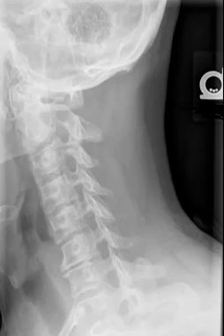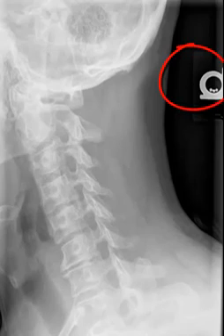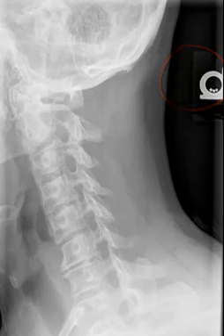When you're looking at cervical spine oblique projections and the clinician did not use a marker specifying whether it was an anterior oblique or a posterior oblique, we can simply deduce which side of the patient is which. If you pay close attention to our radiograph in the right-hand margin, your right-hand side, you'll notice that there's a left marker on the radiograph. This implies that this is the left side of the patient, also implying that the area on the opposite side of the spine is the right side of the patient. So we don't always know how the patient was positioned prior to viewing the radiograph.